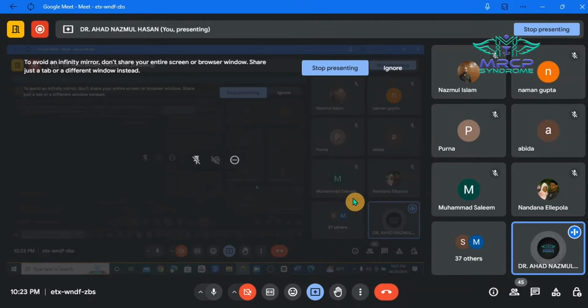So in case of T1, which component would be bright? Fat. Yes, the fat component should be bright. And what should be the water or CSF in T1? Dark. Yes, it should be dark. And in case of T2, which components are bright? Both fat and water. Yes, very good. So both fat and CSF would be bright. So the CSF would be black or dark or hypointense in case of T1, and the CSF would be white or bright or hyperintense in case of T2. So by looking at the CSF, we can easily differentiate whether this is T1 or T2.